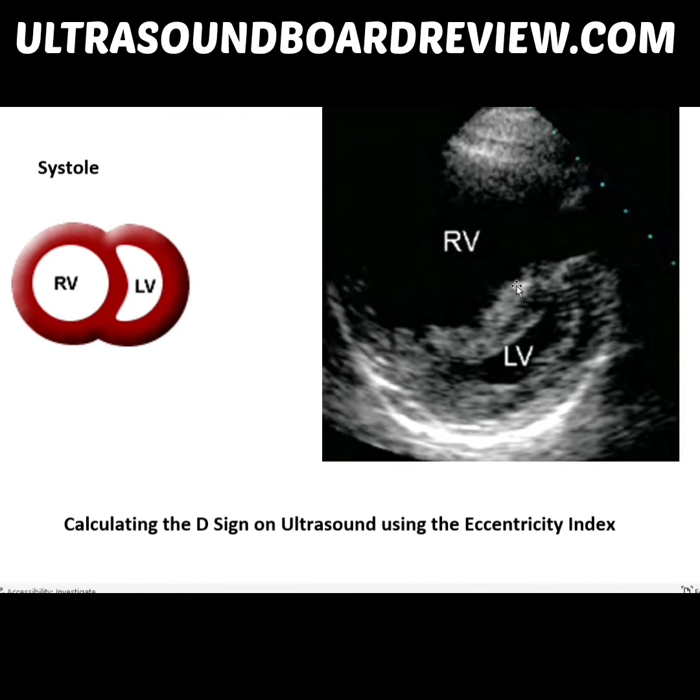And then in systole, you can appreciate the septum is still flattened. It's almost pushed in here, making that crescent shape. On your boards, however, just look for flattened septum in diastole and systole. But when you're looking at it on echo, the pressure is so high, it's almost making the left ventricle completely collapse in systole.